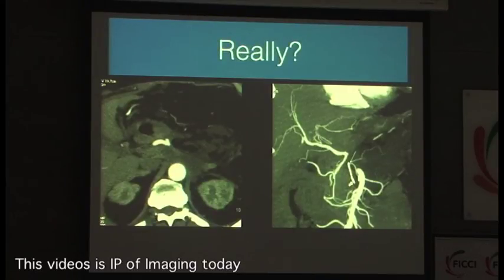So there is something called a modified Appleby procedure where you can take off the entire celiac trunk. Fine. And that is what the surgeon did. He took off the entire celiac trunk with the body of the distal pancreas and tried to put in an arterial interposition graft, which is this. Can you see this faint hyperdensity? I am not sure you can. Can you see it? This was the graft. The graft got thrombosed. This was a collection around it.